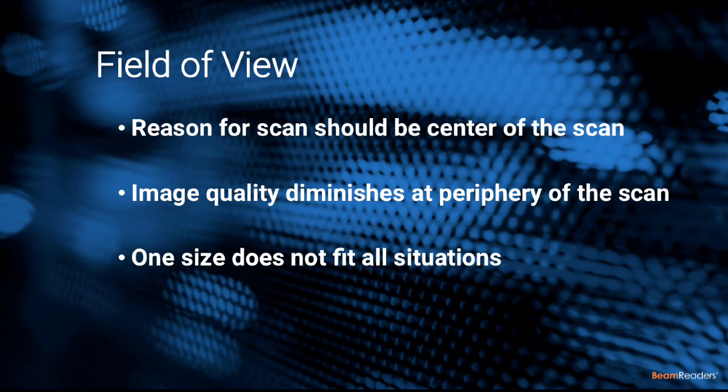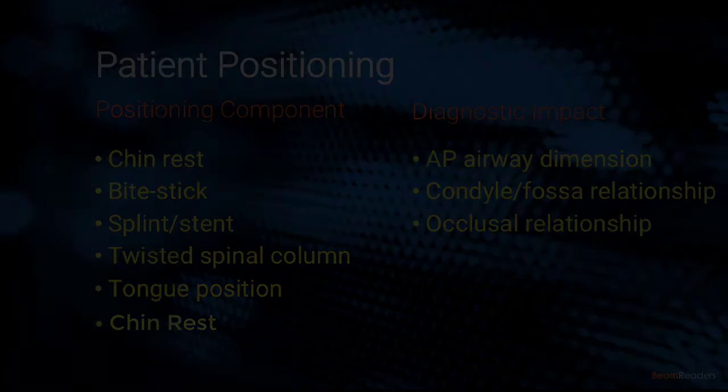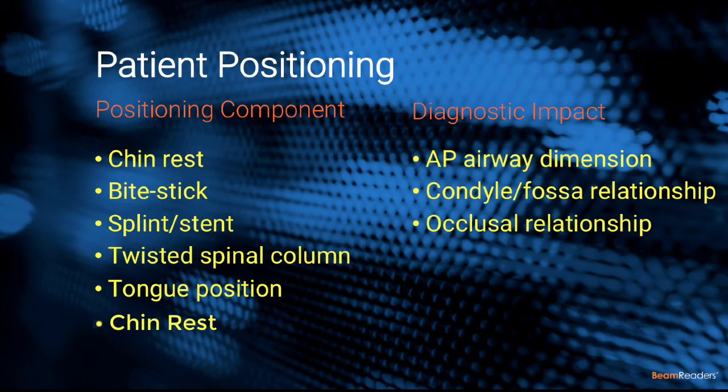If you're looking at an accessory canal and a root canal tooth, you don't want to use the same scan that you would use for a beginning orthodontic case evaluation. So let's look at some of these positioning components and their impact on diagnostic quality. So let's start with the bite stick.